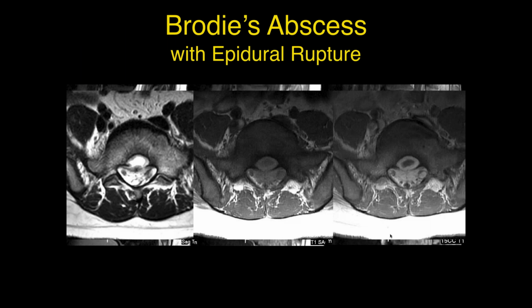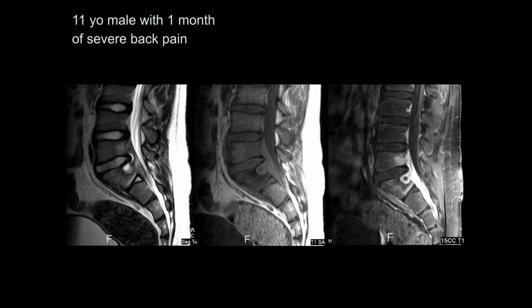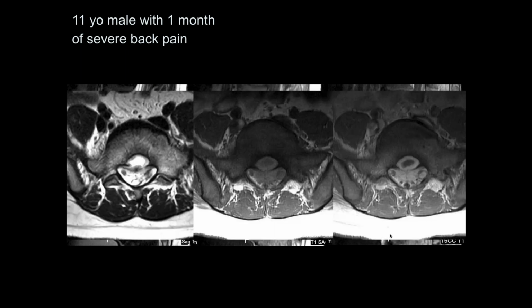Okay. Now, do you mind going back to the sagittal? This is a question I had on another one of these. You showed us one of an abscess in the epidural space before, and there also I didn't really see so much of a collection as just enhancing soft tissue. Here you called it a collection again. Is there fluid in there that I'm missing in the epidural space? I mean, it's clearly related to the infection, obviously, but what is that stuff? It's not an actual fluid collection. It's fluid and inflammation. It's an abscess. Yeah, okay, inflammatory tissue.